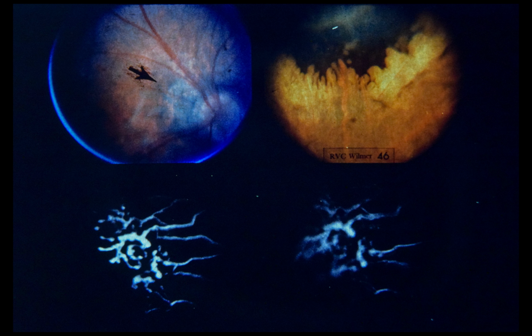Lower left, in angiogram of temporal periphery, just posterior to the equator, note classical telangiectatic-like vascular arcade. This type of vascular abnormality is common in arrested retrolental fibroplasia and represents the most anterior extent of retinal vascularization that is ever achieved. Lower right, 5 seconds later in dye transit, note early leakage from abnormal retinal vessels.